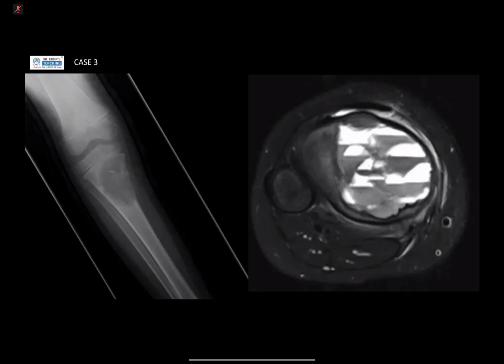Excellent. Really nice description and summary. You've pretty much stolen everything on my next slide, so well done. This is an aneurysmal bone cyst. They're usually lytic, expansile, eccentric, tend to occur within the metaphysis but can expand into the soft tissues. You can see on the axial image here we have a trace of periosseous edema. They tend to be well-defined with thin sclerotic margins, and you see the characteristic fluid levels as demonstrated on this axial image.